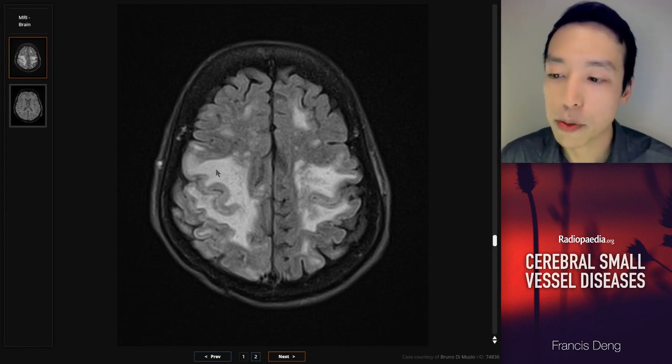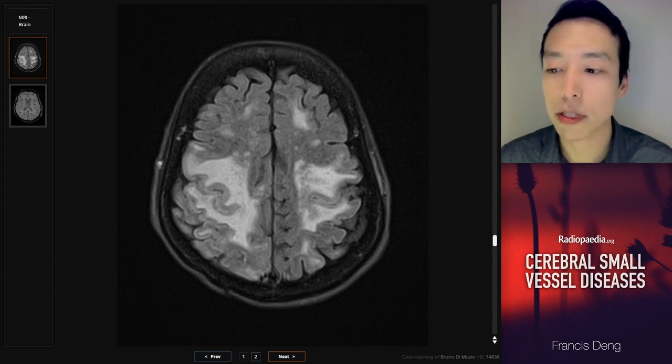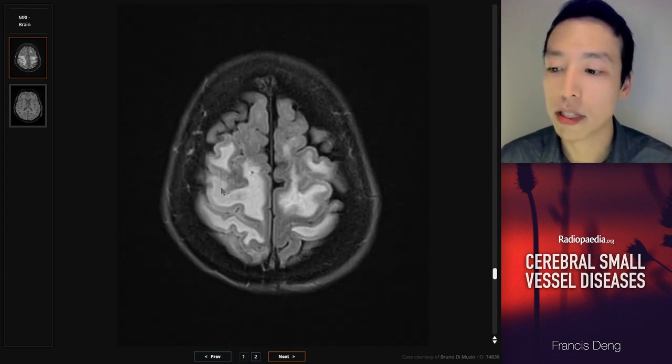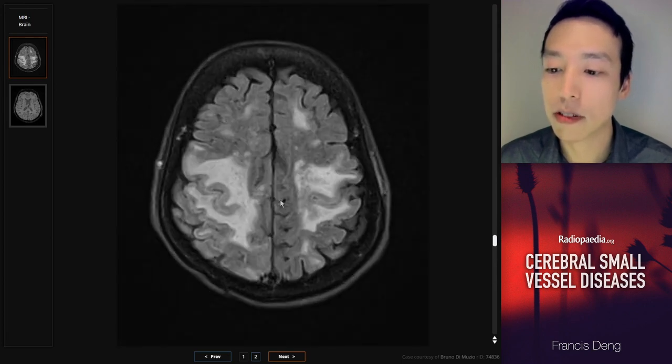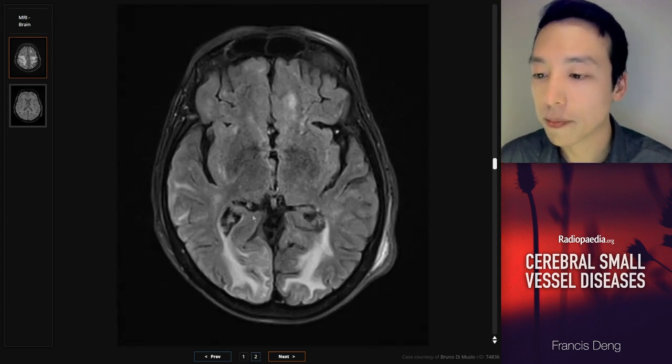They have these white matter hyperintensities, but they're a little bit unusual from the ones I've been showing you so far. These seem to have some mass effect in the perirolandic region. This precentral gyrus looks expanded. So there's some component of vasogenic edema happening here.